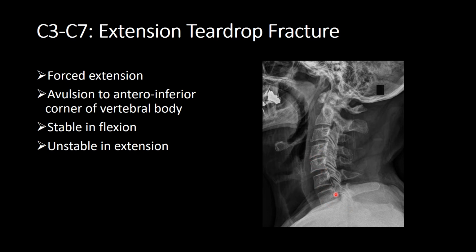Let's go around the pedicles. Let's look at the posterior arch of C1. Let's look at the articular pillars. Let's look at the lamina. Let's look at the spinous processes.